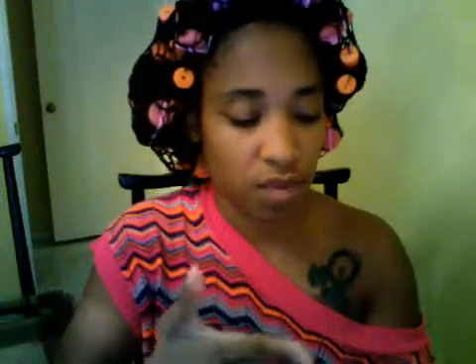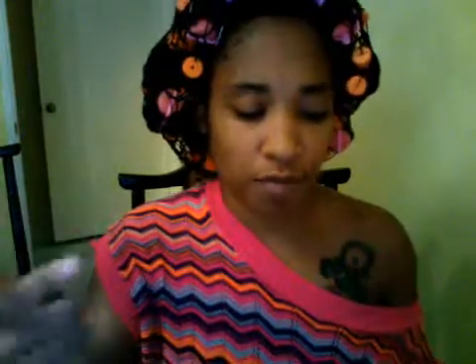But it's easier to remember, so at least that way you don't have to remember the other one, the rule of 300s, which goes 300, 150, 100, 75, 60, 50, 43. Nothing really makes sense, and it's really hard to remember. So good luck for those who like that. The 1500 is easier for me to remember. You just count every little box and divide 1500 by that number.